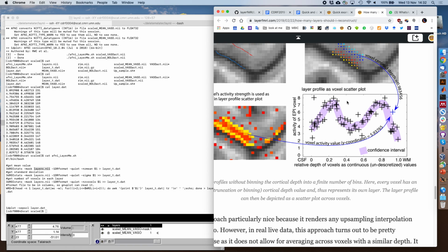If you see a point cloud like this, and the purple line you drew, that's already a confidence interval. But what you could do, for example, is say, well, that looks like an x to the power 4-ish function, so let's pick those 5 parameters and test those 5 parameters. That's a way. I think we're done. It's not the only way.